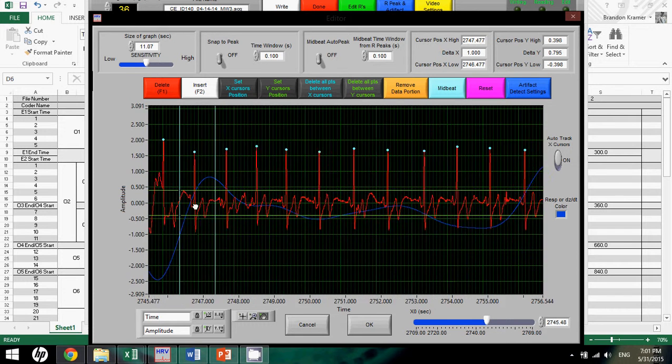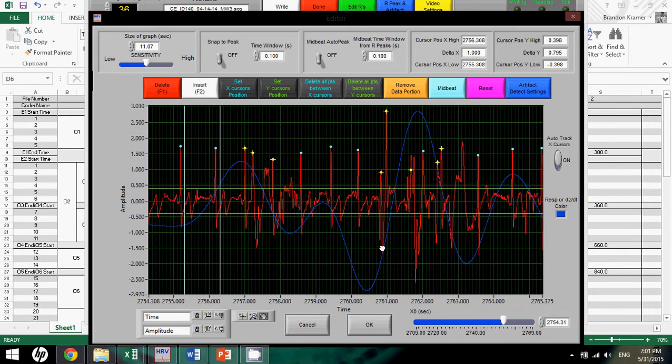We'll go ahead and keep moving our data over and take a look at what we've got going on here. We can see that what happened basically is that a participant was moving around and had a lot of artifact that they created by moving. Either that, or it's probably the case that that's what happened here. So basically what we're trying to do is get rid of all these stars and save the segment. In some cases this will be possible, in some cases it won't. In this case I do think it's possible, having looked at this data before. However, I wouldn't necessarily know that if I was just starting to do this process.